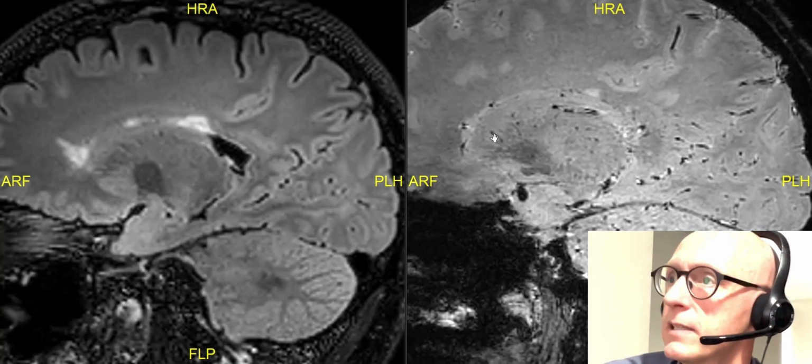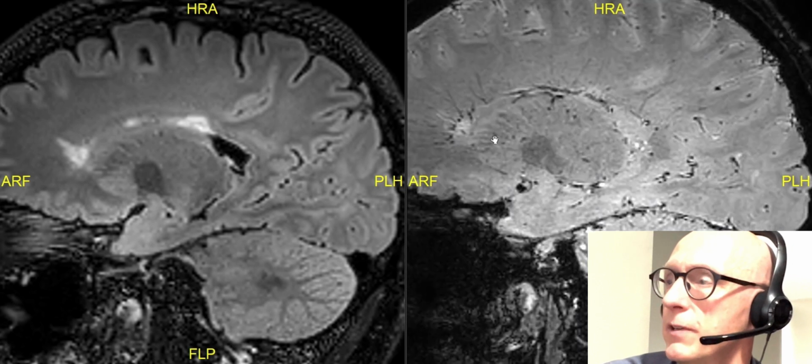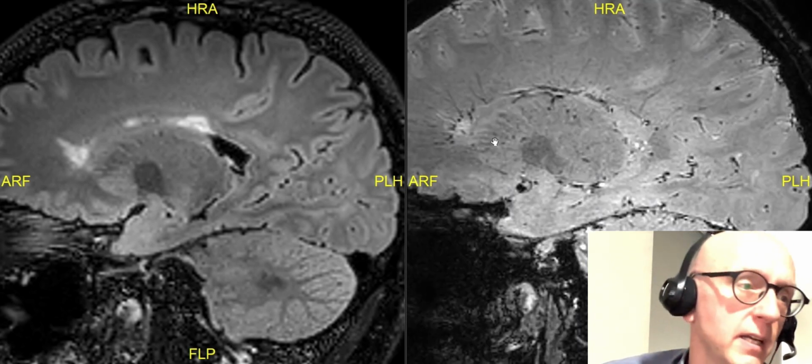But it can still, in those cases, on occasions, be quite useful if you happen to be lucky and can see those discrete lesions.